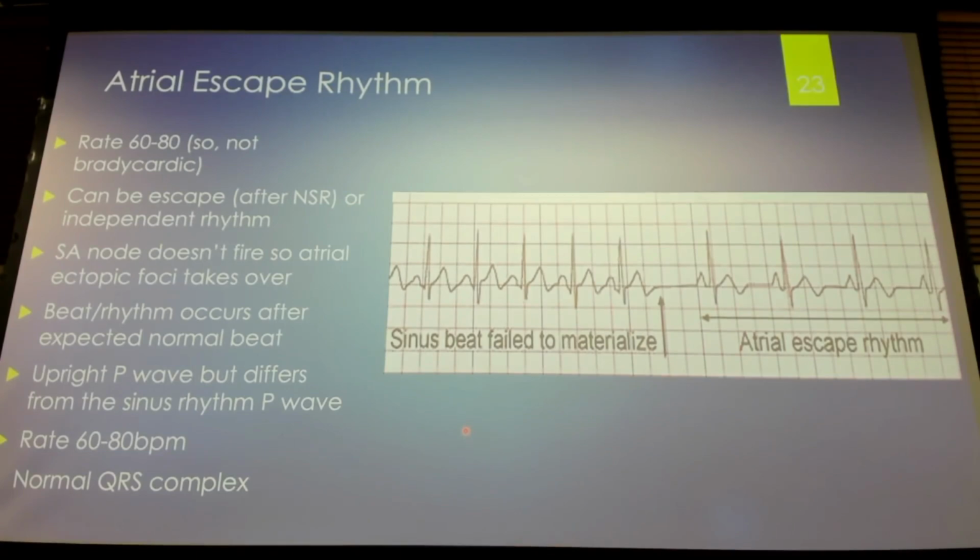And again, last is our atrial escape. Again, atrial escape often does not cause a bradycardia, but I want you to have it in thought when you're talking about escape rhythms, that sometimes if the SA node doesn't pace, then the primary responsibility is for the atria to start pacing. Somewhere in the atria, it's usually one focus that will start pacing. So you may see that normal rate and rhythm where you have your PQRST, and then you've got a pause. And that pause is just long enough for the body to realize something else needs to pace, and then the atria can start pacing.